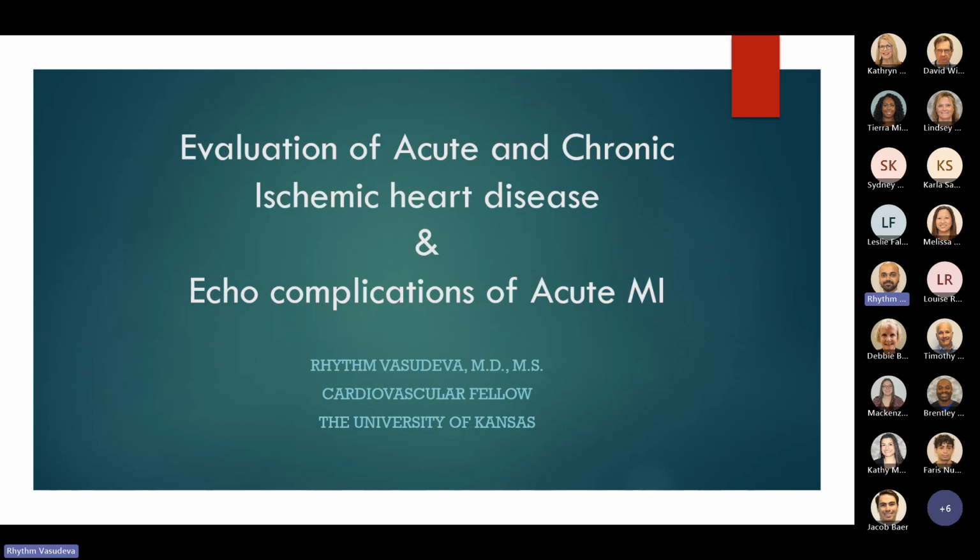I have a format where we can first show an echo complication, then people give a guess at it, and then we'll get into some specifics.